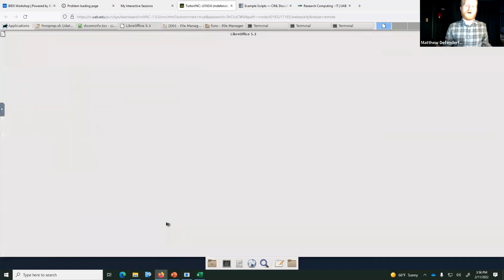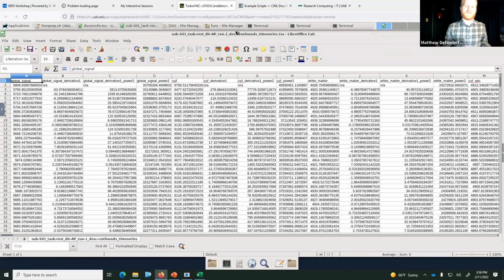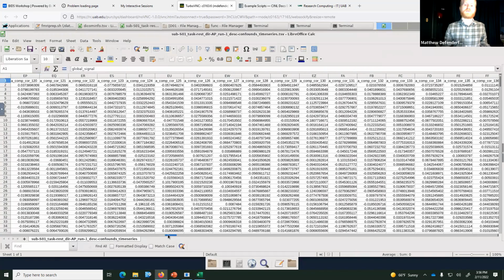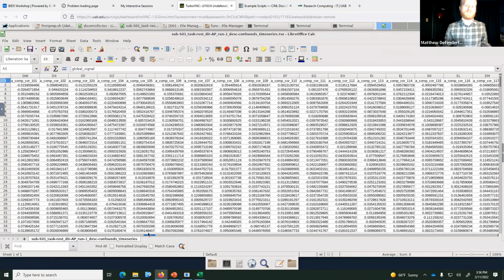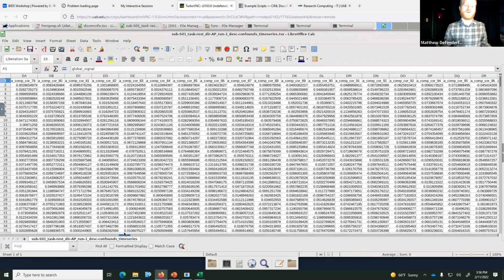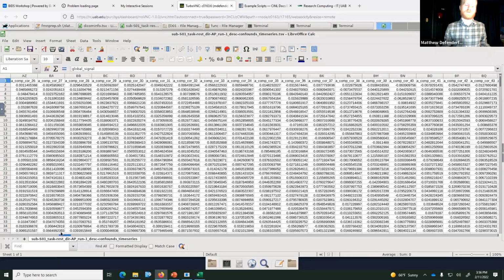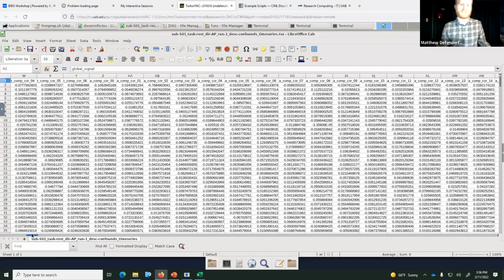Yeah, okay. So as part of the outputs of fMRIPrep, it also outputs confounds, so global signal. It has derivatives for the CSF, the white matter, and it performs a CompCor for you to use as principal component, or as component regression.